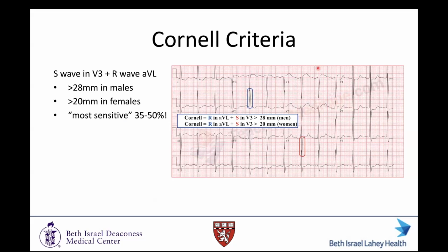One thing on the far left of this ECG tracing, which I think is always important to note when you see very high voltage, because you'll see this once a year, is the scale, right adjacent to lead 1 and lead 2 and lead 3. You see that little rectangle that's missing the bottom of it. That is the scale, and it's a normal 10 millimeter scale.